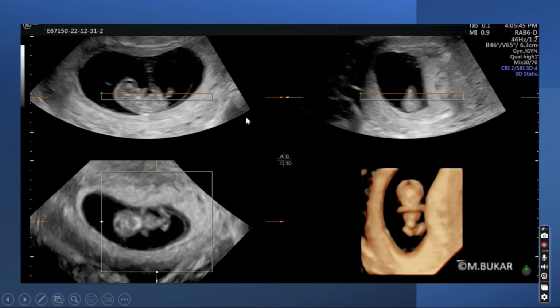This is the rendered image. You can see the reference dot here, the umbilical cord here, the amniotic membrane can also be seen here, and this is the chorionic cavity. On grayscale, the herniation is seen as a small echogenic blob which extends into the umbilical cord, as is seen here.